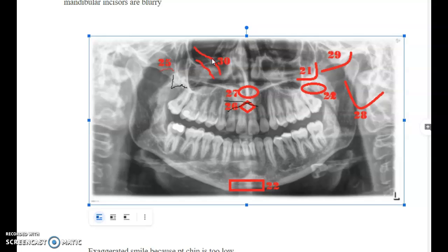I'm sorry. So okay, to fix this panel, what can be improved? I'd say the smile is there again. So probably the patient's chin is too low. So maybe adjust the patient's chin, and there's a little bit of shadowing as well. It's not prominent, but mostly to fix that, positioning of the patient. And that's it.